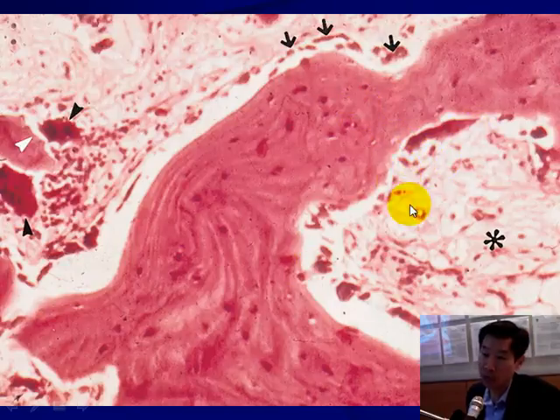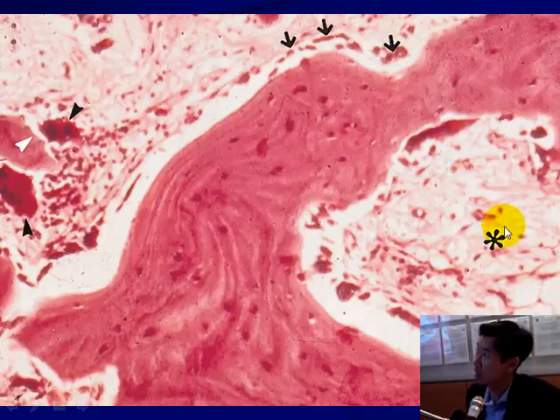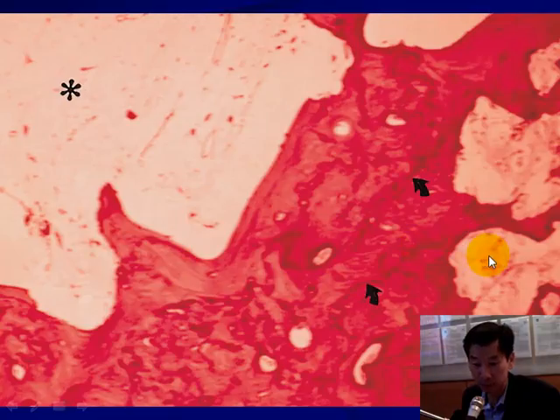And here in the medullary space, we're seeing tissue that instead of normal yellow marrow, this is fibrovascular tissue, lots of vascularization, as you can see, these little red things. And so fibrovascular tissue. This is the mixed phase of Paget's disease.